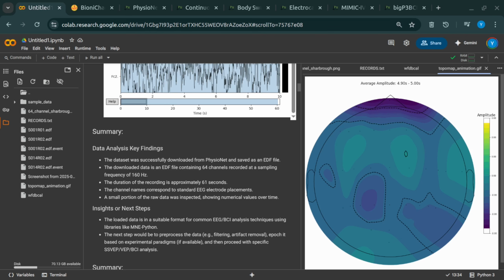EDF. And that's important because it's a standard format for medical time series data. Knowing it's EDF tells you a lot about its structure right away. It's designed for this kind of work, which is crucial for sharing and comparing results in research. Makes sense. So you've got the right file, correctly named. What's next? Loading it up.